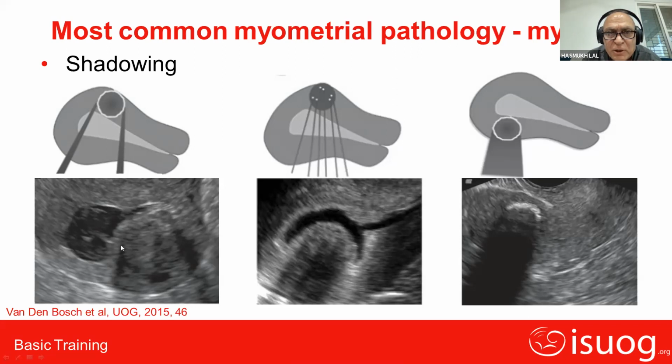Number two is because of the echogenicity. Why is this echogenic? Because it is not allowing the sound to pass through. That is why the shadowing lines are there. This hyperechoic region is reflecting all the sound 100%, and nothing is allowed behind this.